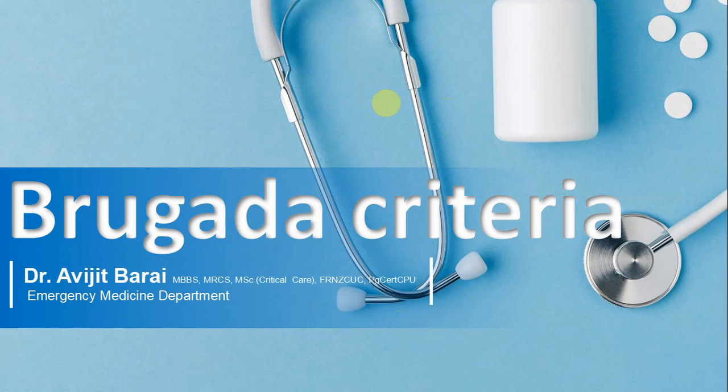There are 4 steps in Brugada criteria that you can use if you find a wide complex tachycardia to diagnose VT. Differentiating VT from SVT can be a big challenge, and that's why I have prepared this video for you so that you can use this in your day-to-day practice. We see wide complex tachycardia in the emergency department quite a lot, and we use this Brugada criteria every day, and we thought we'd share our experience with you.